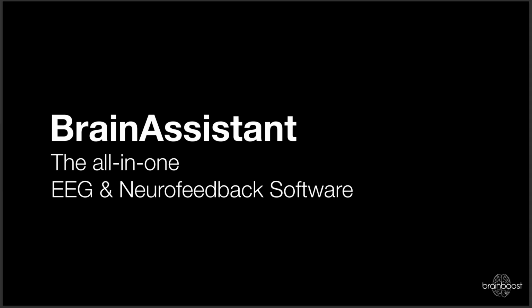All right. So, thanks for being here. And let's start. I'm going to share my screen. As always, this webinar will be recorded and you can ask questions in the chat, and of course in between. Then I will see if it makes sense. So I'll try to have an eye on one screen for the questions, but afterwards, of course, you can ask questions. Yes. So I think you should be able to see my screen. Maybe you can give me a short hint in the chat or some emoji reaction or something. Yeah, perfect. Thank you.